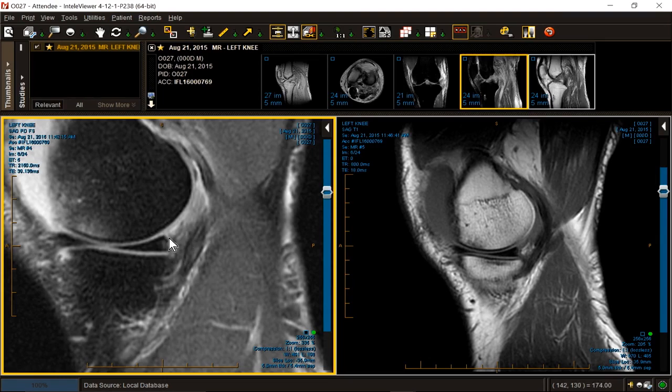You should have a discrete little band of low signal here with a clean little fat pad behind here and a little bit of capsulosynovial tissue, but not this globular gray area, which is blood that has now filled the meniscocapsular junction. And look at the main semimembranosus. It's swollen and injured. Here is the distal bundle, by the way, of the semimembranosus attachment.